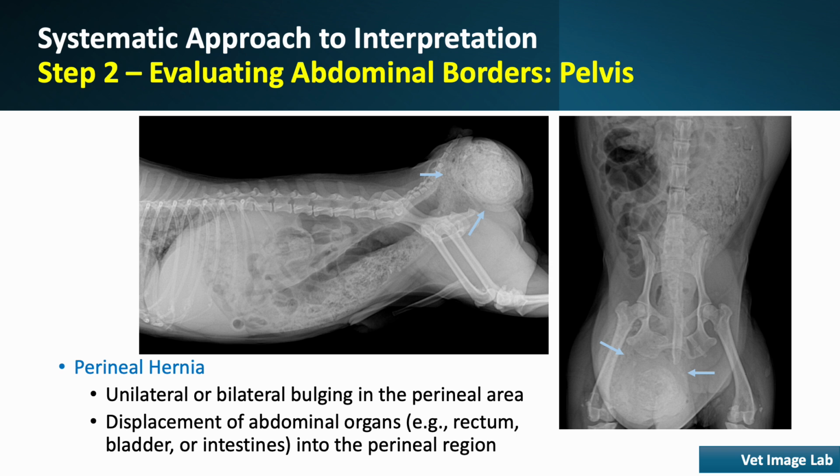Loss of normal pelvic diaphragm support. Compare the affected side to the normal side. There's usually an obvious asymmetry.